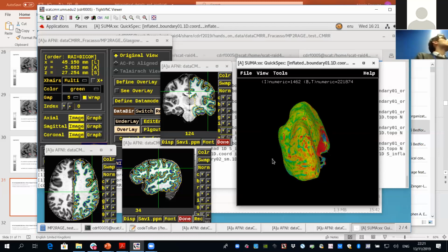What's the difference between generic FreeSurfer segmentation and yours? Well, that's the thing. I make it work on sub-millimeter data out of the box, and I never managed to make it work properly from FreeSurfer with the MP2RAGE.